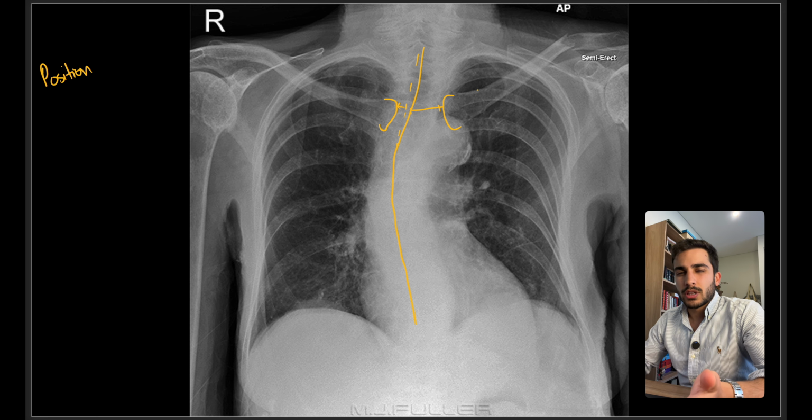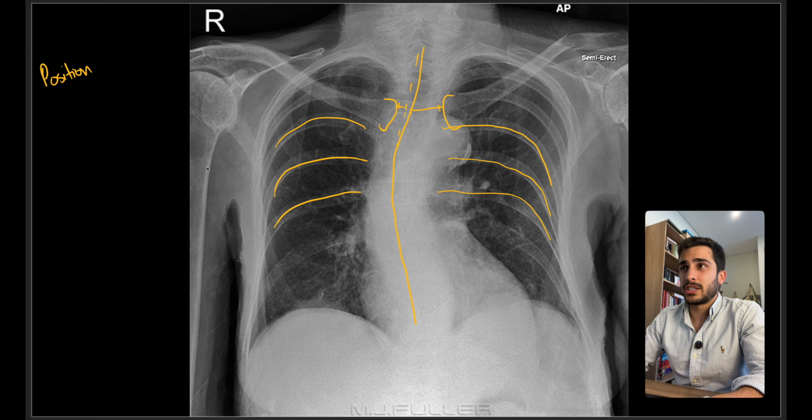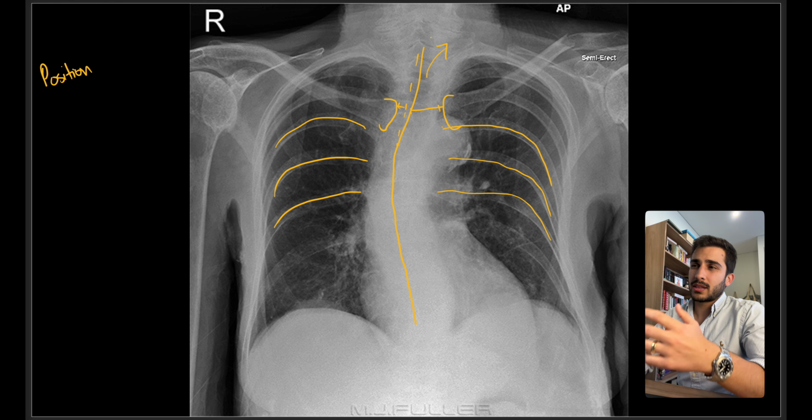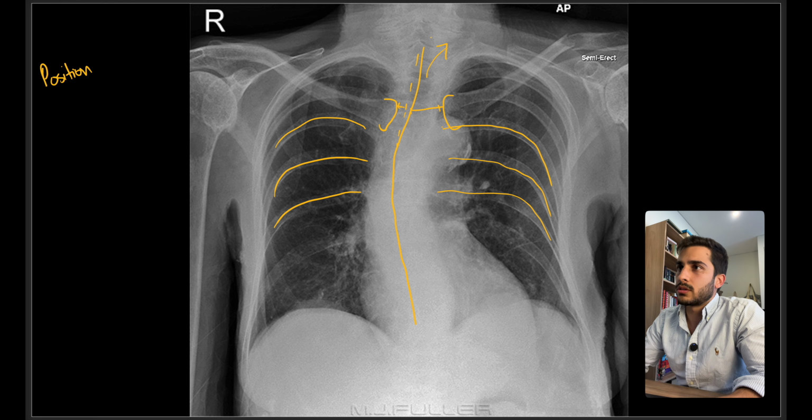And you can tell that because of that rotation of the spine, you can actually see the ribs being asymmetric as well. Okay, so look at those ribs compared to these ones. They just look very asymmetric. So in this case, it's very hard to tell if the patient is rotated, just given the scoliosis that's present. The other question is, is there any tilt in the patient? Again, if you just squint your eyes, it kind of looks like there's a little bit of tilt towards the patient's left, but I think that's just the illusion that you get looking at the scoliosis of that patient.